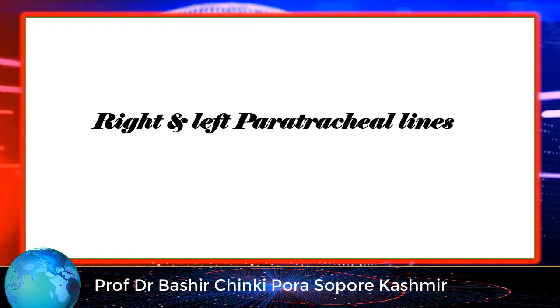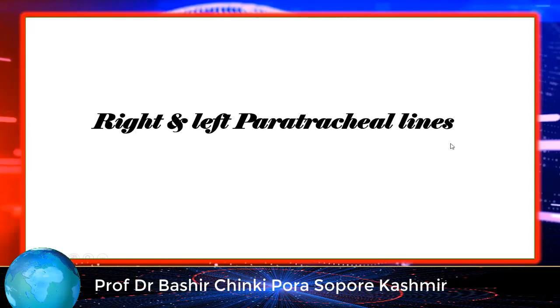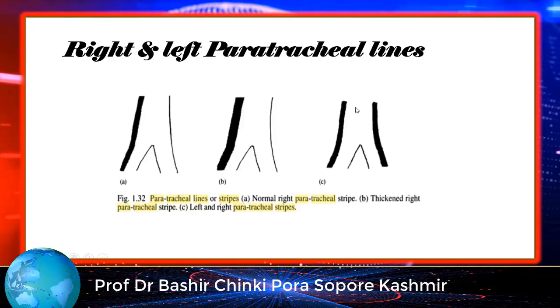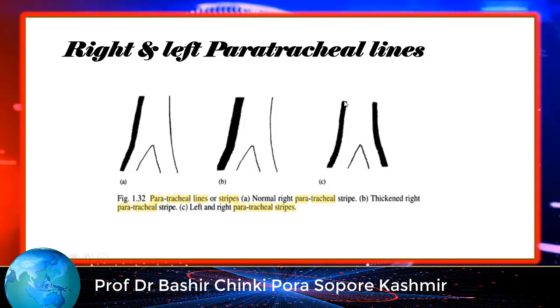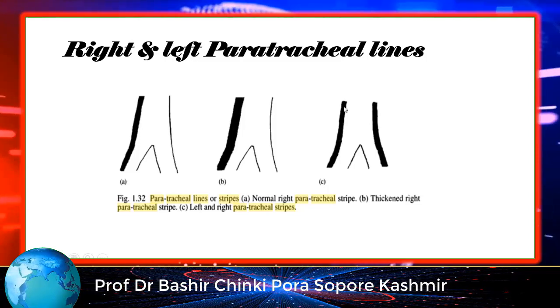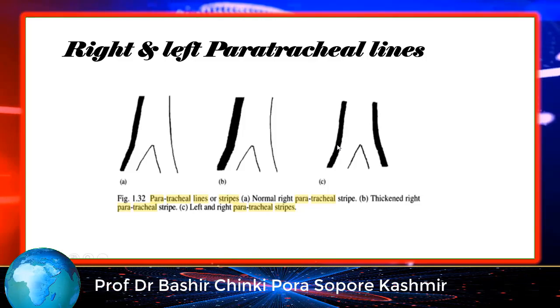Now coming to the right and left para-tracheal lines. In this image, you see there is a linear opacity. This linear opacity we will be seeing on the radiograph.